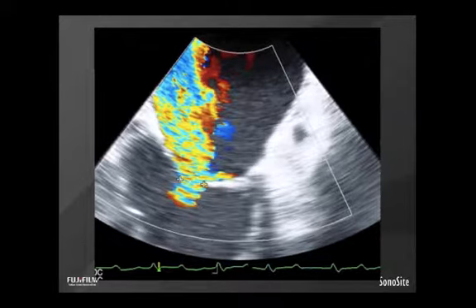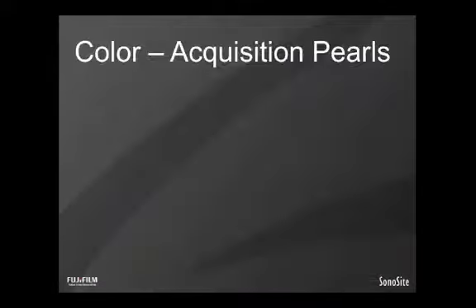And though it's not seen on the screen here, this measured up at 9 millimeters and was consistent with severe MR. And you can actually see this jet is going off to the side a little bit. So that might be a little bit eccentric. And so the amount of area of the left atrium occupied might approach 40%, but by color criteria, this would be iffy, whereas by vena contracta criteria, it's actually very obviously quite severe.